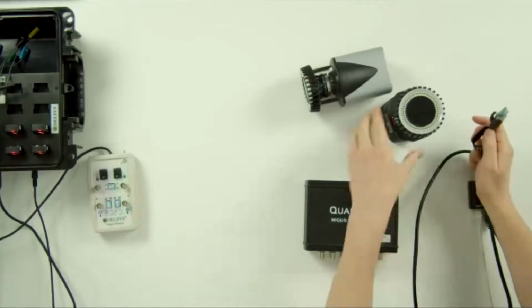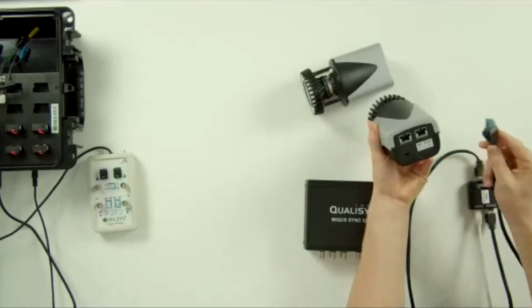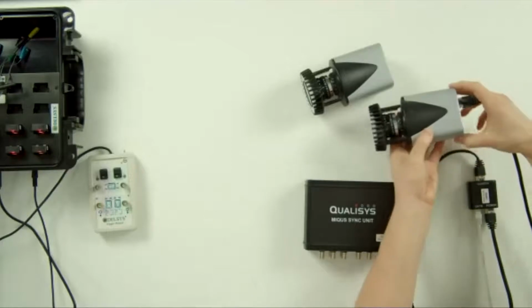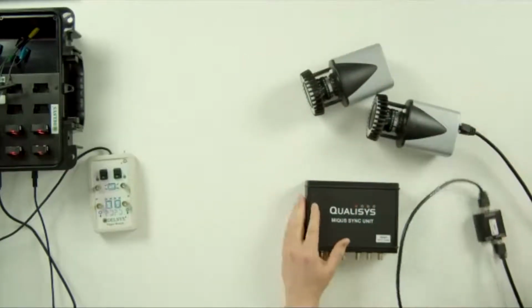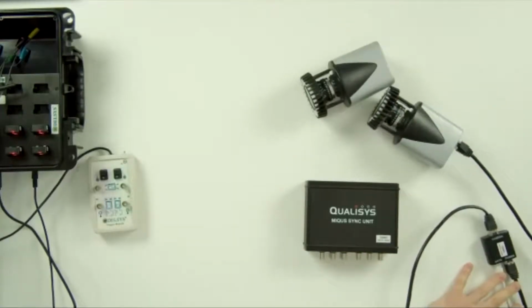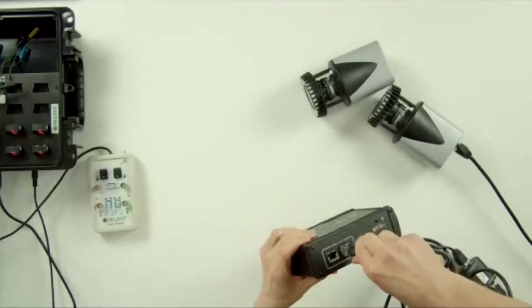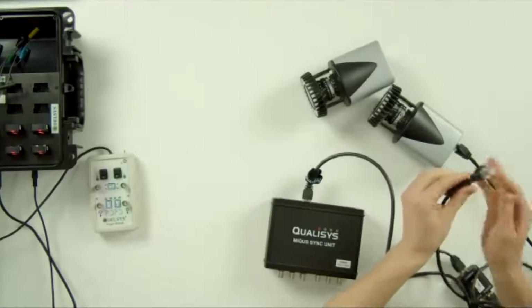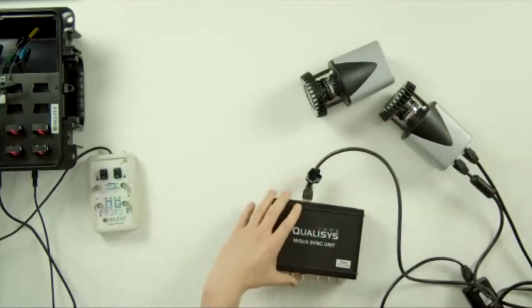So we get the other end, and in the rear of the camera, there are two ports saying data/power. And we'll connect that in here. At this point, we could daisy chain multiple cameras together, like Niels has indicated, or different camera types. And then the last camera in the chain can then go back and plug into the camera sync unit. In this case, I'm just going to connect one single camera like this.